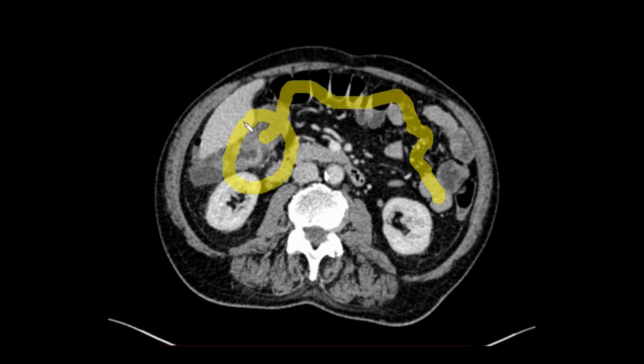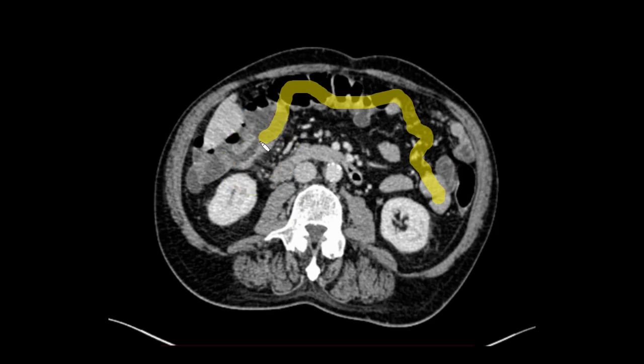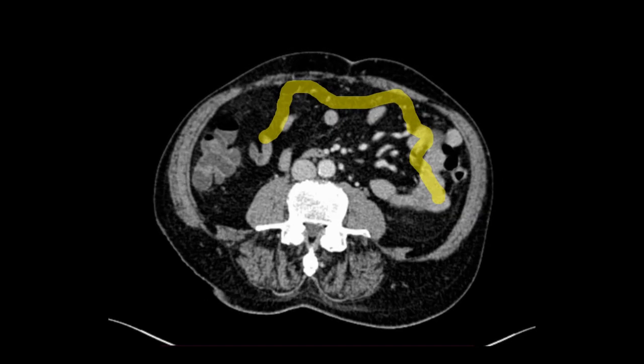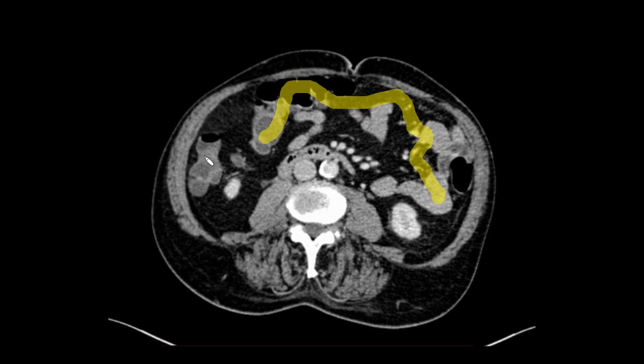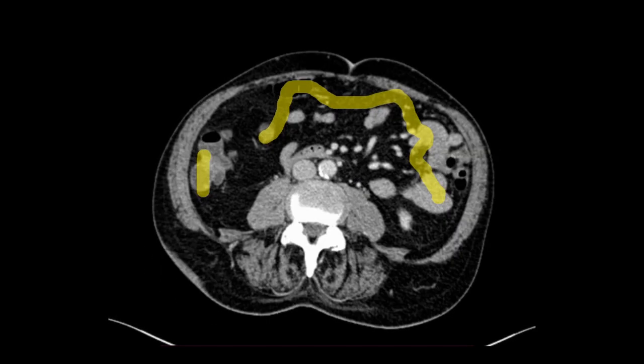And now if you see this area, I'll just remove my mark. This is a thickening, and this is where the disease is. That is the disease in this case. It's a carcinoma of the hepatic flexure of the colon on biopsy. So this is the liver, transverse colon. This is where it converts from the hepatic flexure to the ascending colon. So if you see, this is the ascending colon and the cecum.